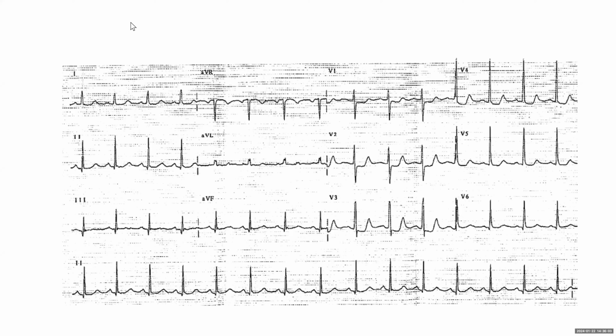Okay, so let's do the obvious ones. So sinus rhythm, posterior MI, recent, STT changes due to ischemia. I think we all agree on these three, right? And then you'll have to add two. There's really nothing very obvious, but let's go through the stuff you guys mentioned.